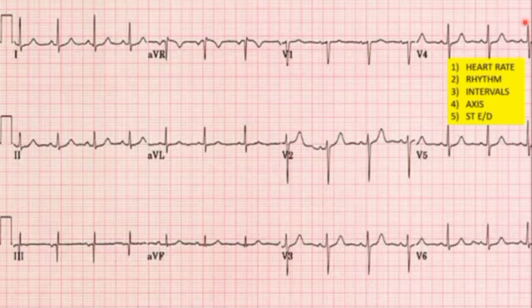Now we'll end this discussion by interpreting a small ECG. Now you have been given this ECG by your seniors. Try to interpret it. You are in the hospital setting. As soon as you get the ECG, check if this ECG belongs to the appropriate patient and know about the chief complaint and history.